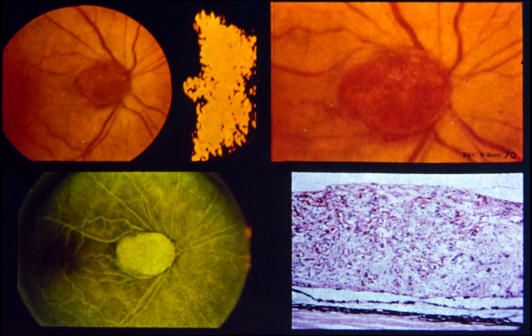Slide 70. Angioma of the disc. Retinal angiomas may occur anywhere in the fundus, including the disc, as illustrated in the following case. Upper left, note large disc angioma and its accompanying appearance on B-scan ultrasonography. Upper right photograph shows tumor enlarged at 2 times magnification. Lower left, fluorescein angiography shows early filling of tumor.